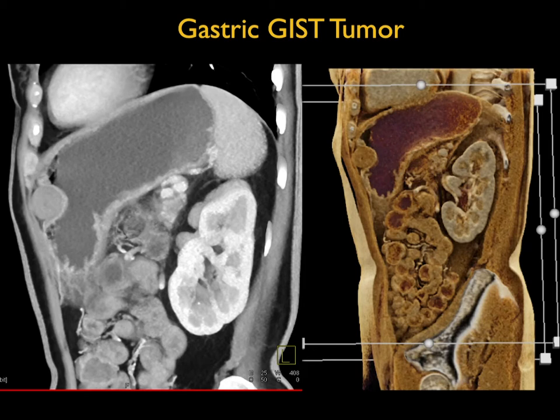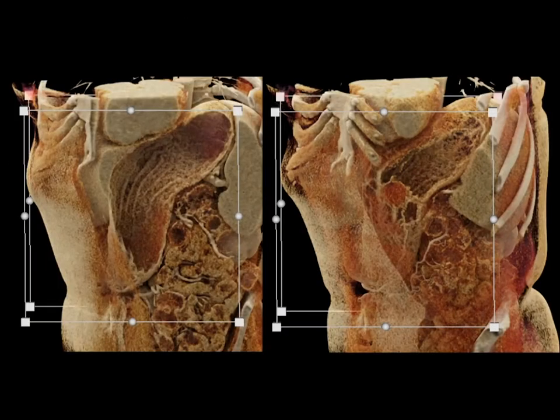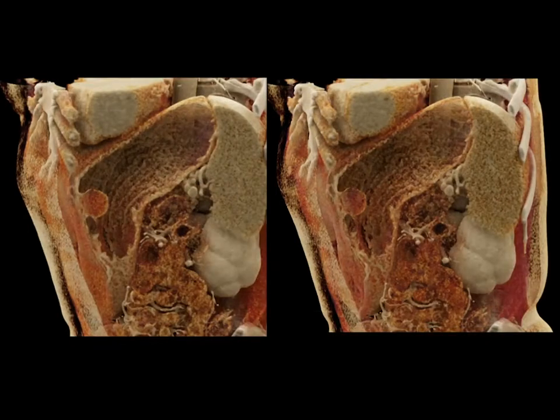And here it is, the lighting model showing you the gastric folds, showing you the tumor, which is relatively homogeneous and of low density. And we believe that some of the information about the density values in terms of water content can be important. And I believe much of this is what happens with radiomics. And you can see it very nicely here as well.